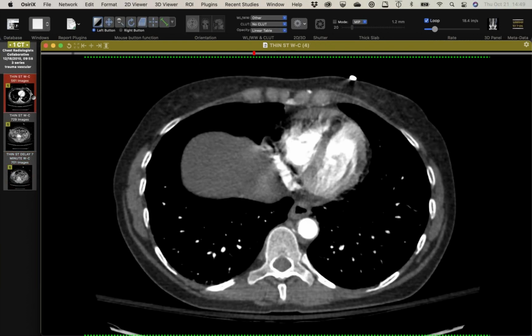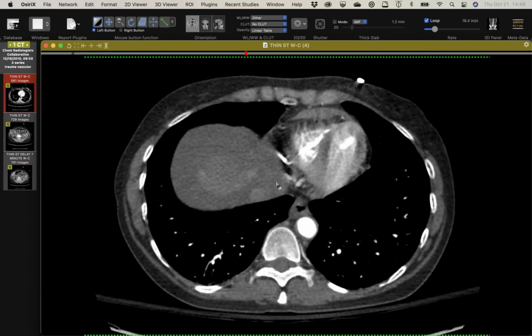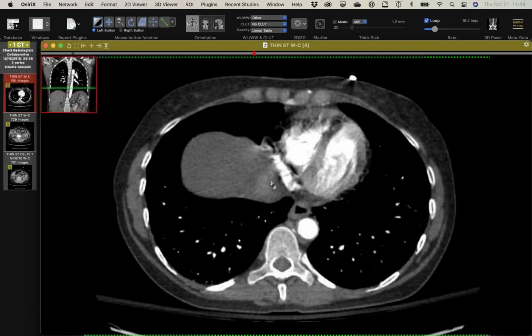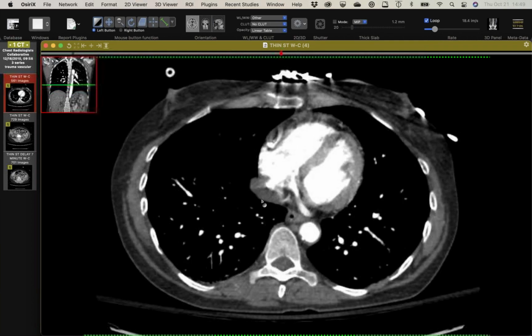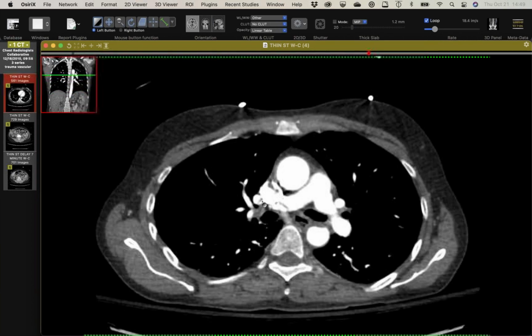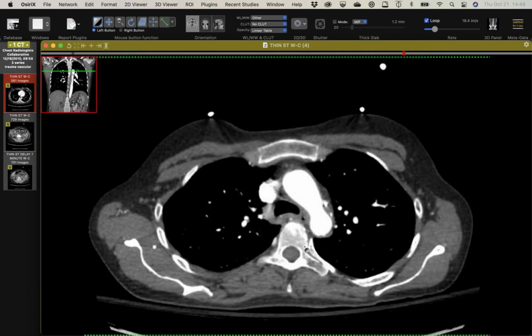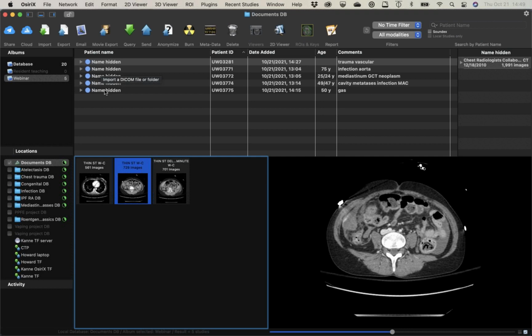What's kind of scary is if you just have a chest CT, it's really hard to see that abnormality right there because we're just too early. And because there's not the usual little bit of reflux, probably because, I bet the pressure in the abdomen has gone up, so it's preventing that from happening. So had some irregularities of the aorta, but they were atherosclerotic. So that's the only time I've seen an IVC avulsion or injury. Nice. Yeah.